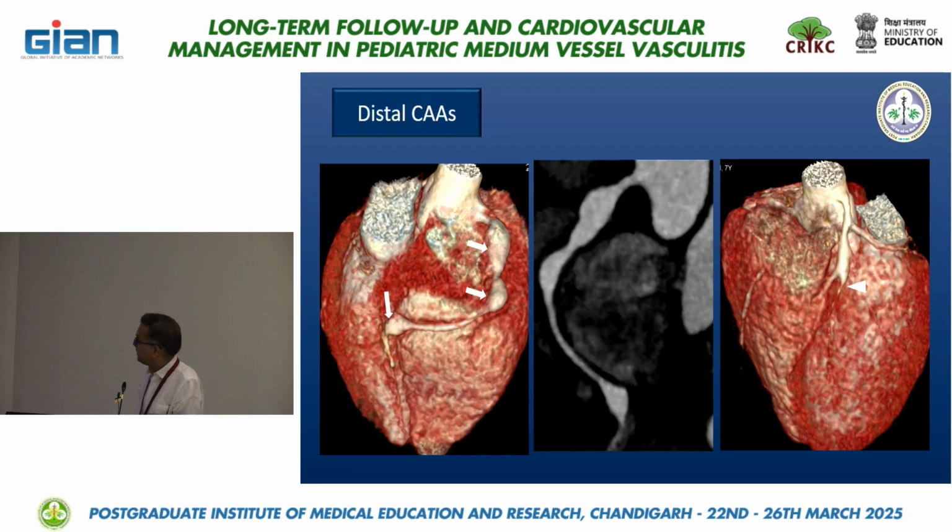Or it may be the involvement of the proximal as well as distal arteries, and the remodeling following resolution of the acute subacute phase, to see for the aneurysm resolution or its changes in the wall thickening, calcification and occlusion.